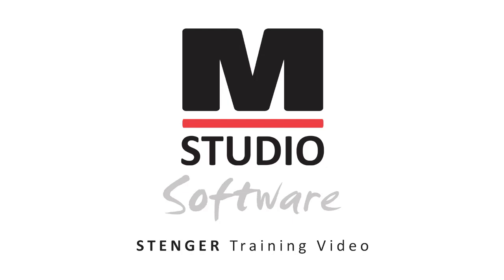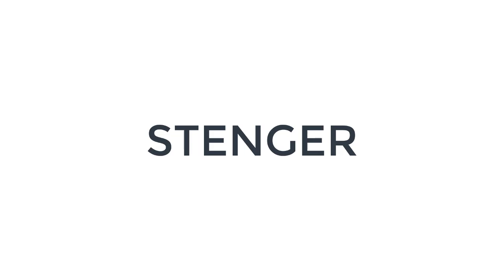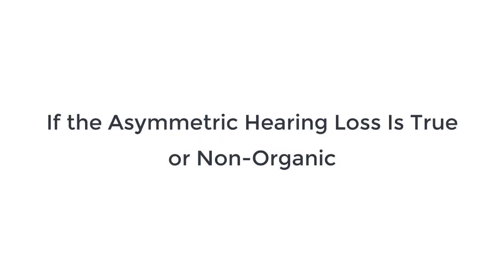In this video, we are going to review the Stenger test and how to perform that test within the Studio software by Medrex. The Stenger test is typically used to evaluate if an asymmetric hearing loss is true or non-organic.